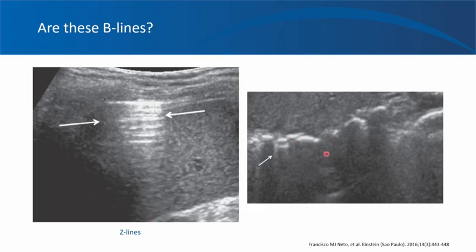And what about these things? So this is actually an example of E lines. And they represent subcutaneous emphysema. So remember, air is white on ultrasound, right? So here is the pleural line, and here are all these broken white things with some shadowing. If you carefully observe, you see some random shadowing coming from these white lines. Obviously, you don't have stones there near the pleural space, right? And these will be moving. If you are looking at a video, these will be moving a little bit, and these represent air in the subcutaneous tissues or subcutaneous emphysema. So both these patterns, if you see Z line pattern and E line pattern, don't confuse them with B lines.